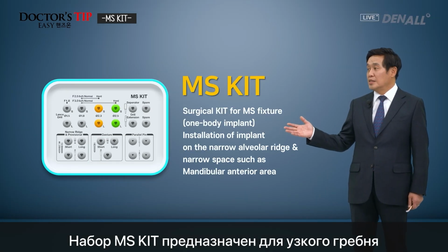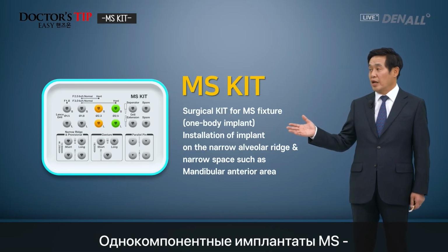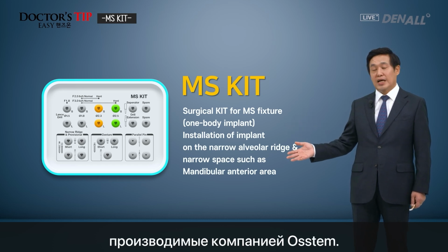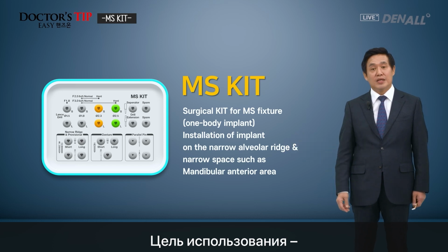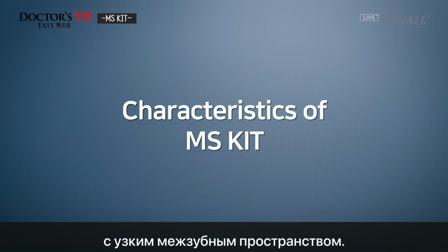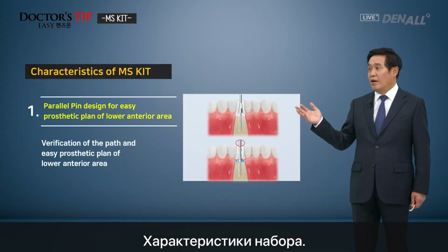Today, I'm going to talk about the MS Kit. MS Kit is for the mandibular anterior side, narrow ridge, and if there is a small space, then you use the MS fixture, the narrow implant from Osstem, and it's a one body implant, and this is for such purpose. So what are the characteristics of this kit?